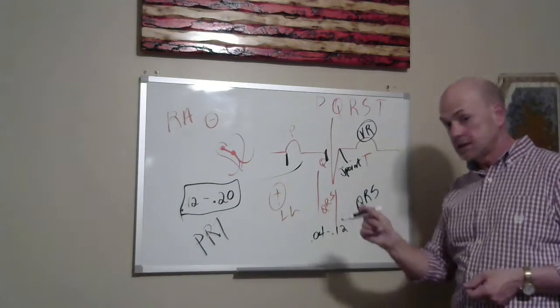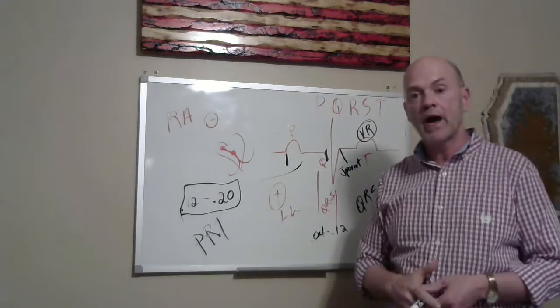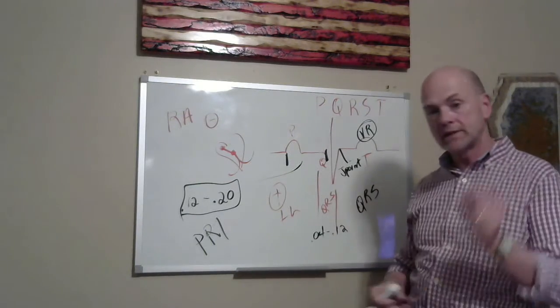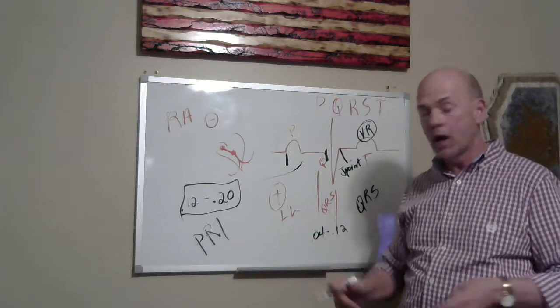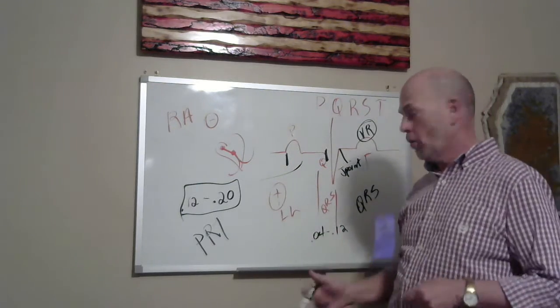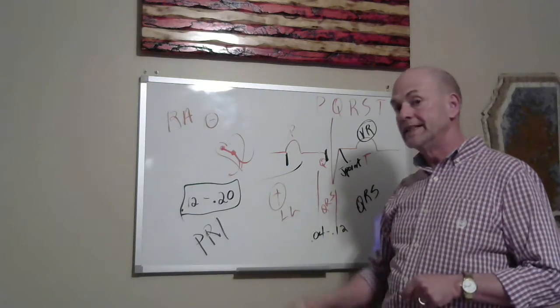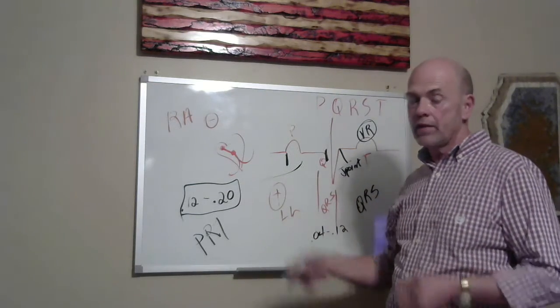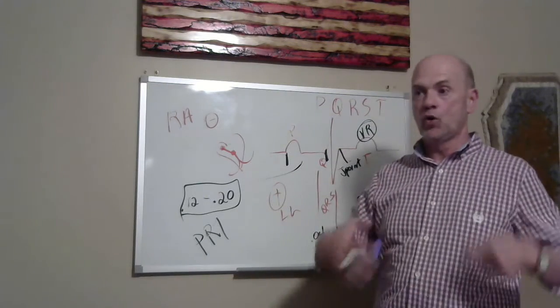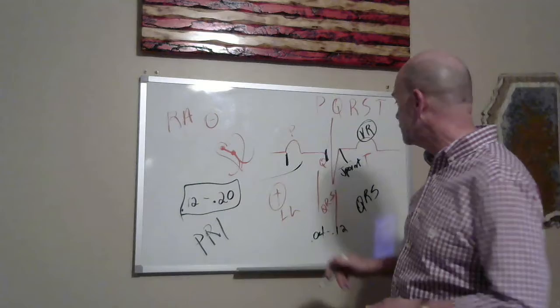On the QRS, it's a narrow complex. When those ventricles contract, they contract quickly, within 0.04 to 0.12 seconds, either one tiny block up to 3 blocks. If it's greater than 3 blocks, something is outside of normal limits. If the PR interval is less than 0.12 or greater than 0.20, it's outside of normal limits. There's something else outside of a normal working heart happening with the electrical system.